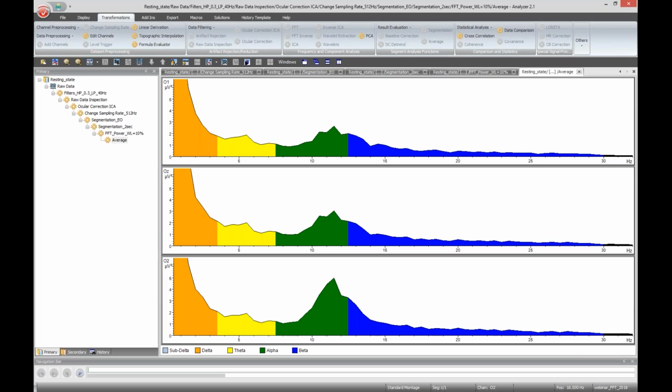In order to observe these bins nicely, if I'm now highlighting the beginning of the alpha band, it says now 7.5 Hertz, right? So this is the beginning of the alpha band, which is the default beginning range in Analyzer. And if I move further to the next bin, it jumps to 8. And if I move further, it jumps to 8.5, one further to 9, 9.5, and so on.